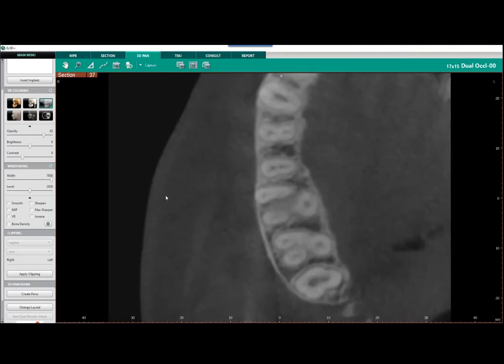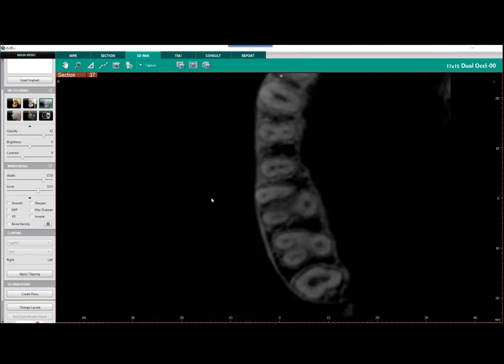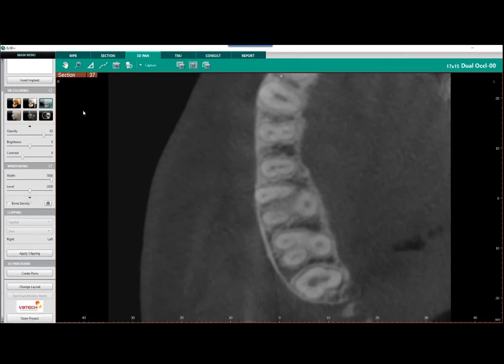Yeah, right. Like that. One other topic for the windowing, you can always right click and drag and just use your brightness and contrast that way. So that does change our brightness and contrast through there. And I'm going to go ahead and reset my density or my windowing there. And if you don't see this drop down here, you always have the little drop down here underneath where you can click up and down here.